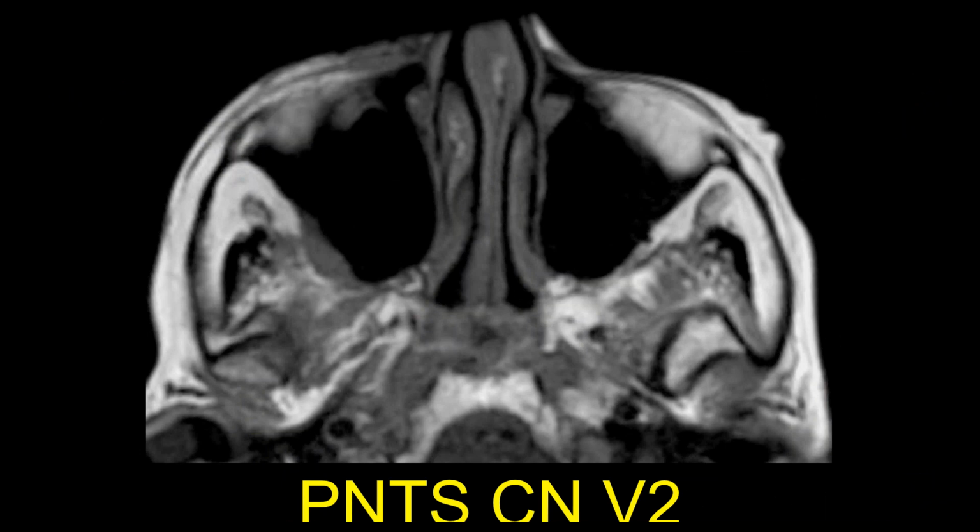It's also very important for perineural tumor spread. When I'm looking at subtle studies, I look at the fat in the subcutaneous tissues, like we talked about the SMAS last month, the superficial musculoaponeurotic system, where we have the subcutaneous fat and the voluntary and involuntary muscles of facial expression. If I've replaced that fat, like this skin squamous cell carcinoma, and I see perineural tumor spread that's actually crawling on V2, on the infraorbital nerve, back towards the retromaxillary fat pad and the pterygopalatine fossa, that pre-contrasted T1 is very important to evaluate this pathology.